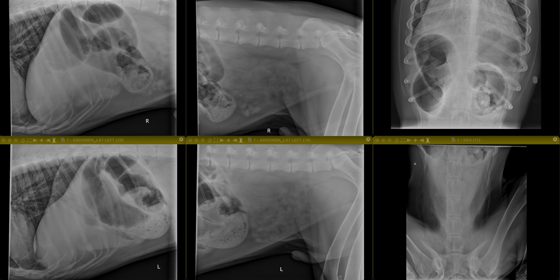The changes associated with the gastrointestinal tract are primarily linked with the cecum and colon. There is global distension of the segment of the colon that is in the region of the ascending and transverse segments. However, the path is particularly difficult to confidently trace.